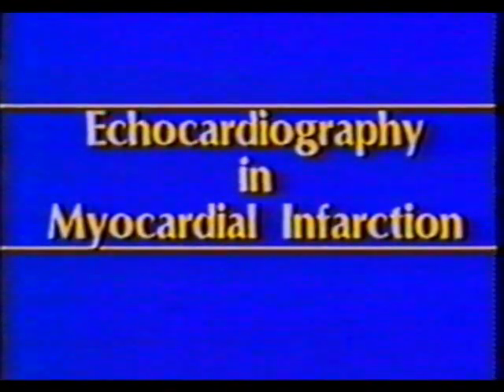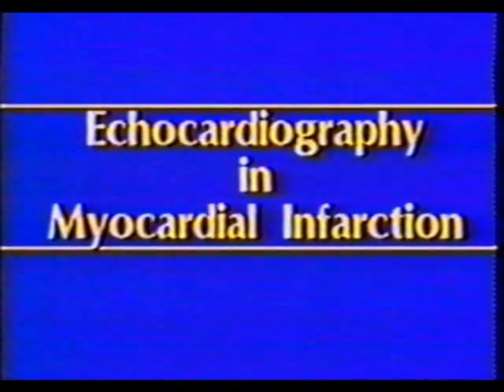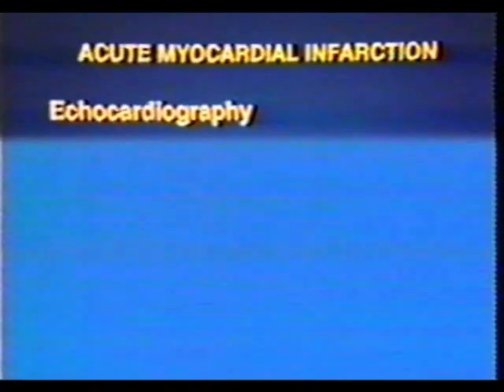Having discussed the assessment of global and segmental left ventricular function by 2D and Doppler echocardiography, we will now turn our attention to the important applications of echocardiography in the setting of myocardial infarction. In our coronary care units, echocardiography is utilized for nearly all patients admitted with acute myocardial infarction. Echocardiography is an ideal tool in this setting.